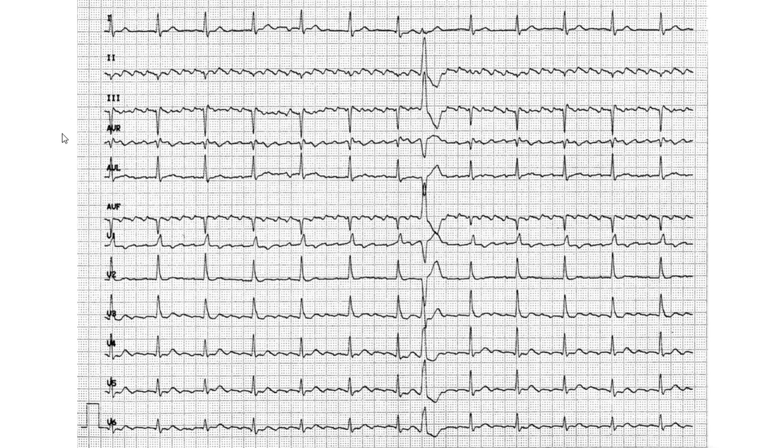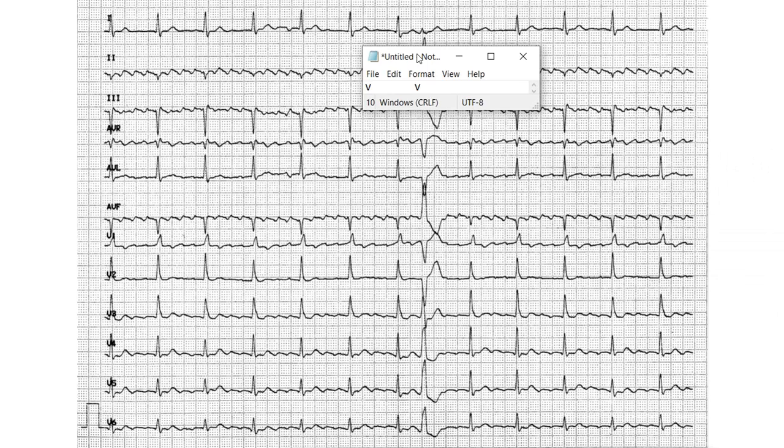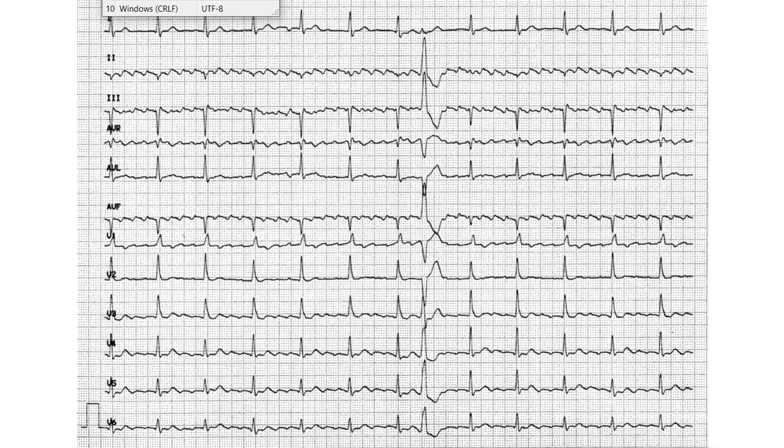3, 2, 1. You can pause, of course, if you would like, and you can do the whole thing if you like. I'm just going to focus on the first point, just to clarify. Again, what we try to do is check, is it regular or irregular rhythm? So we check over here. I'm just going to take this and backspace it once. That's roughly it. I just scan this across.